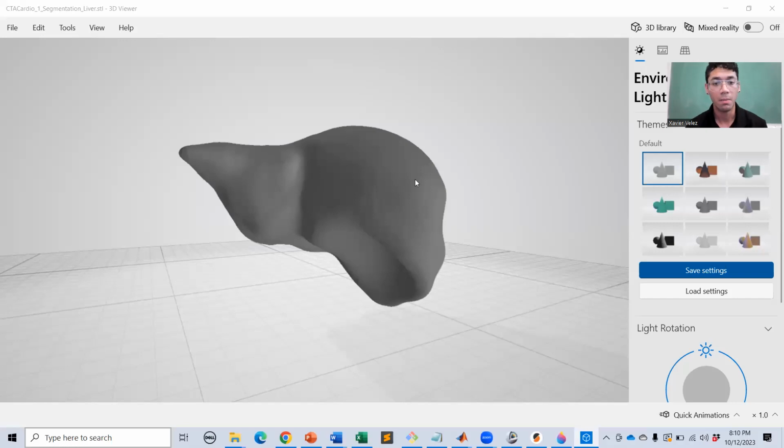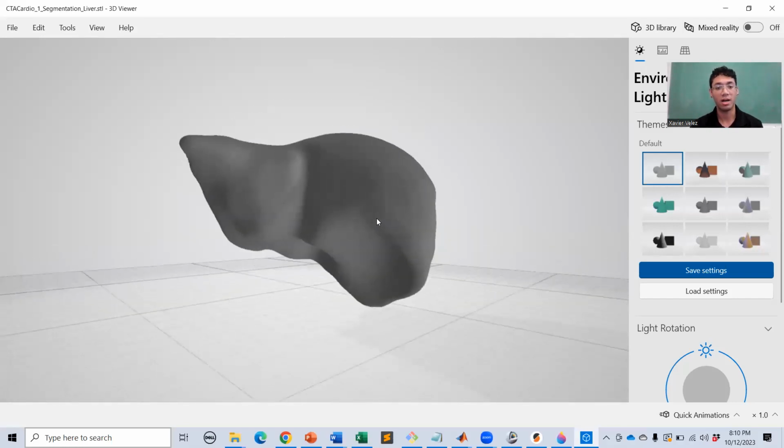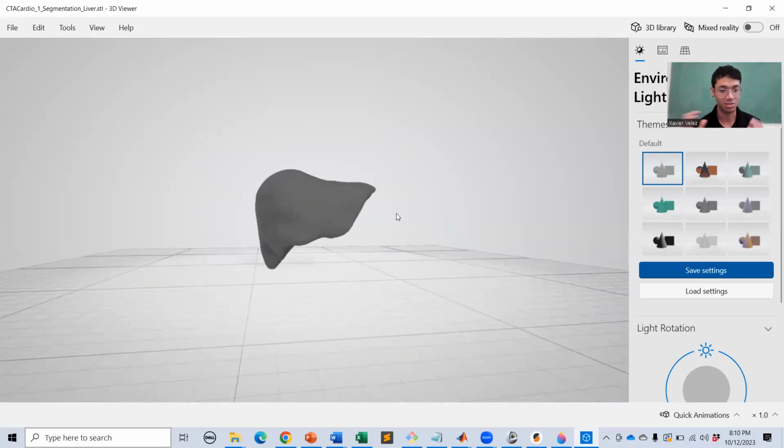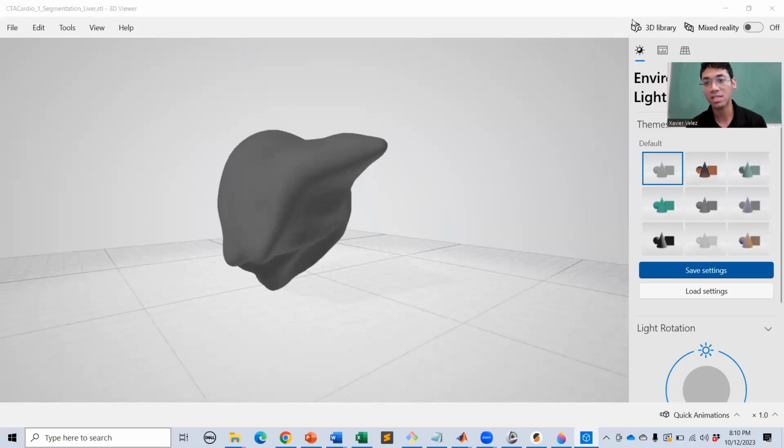Cool. All right. So we're going to want to get our model into a file type called G code. That's literal code that the 3D printer will be able to read instead of just having this object file. This is something you guys don't have to do on your end. This part will just be watching, because I didn't ask you to download this.